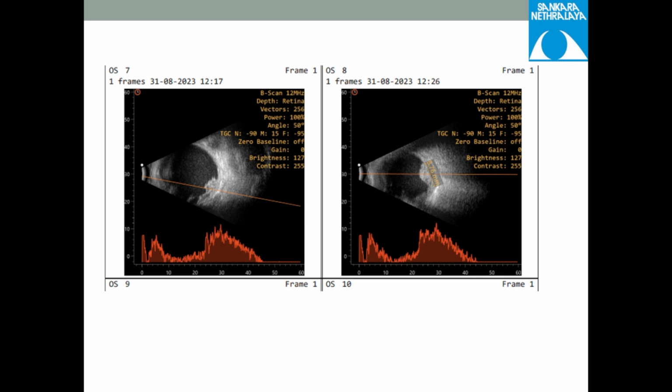It goes like a triangle with a slope. So that's angle kappa. So what happens if there's angle kappa, and what happens at the edges of the tumor then? So you said no acoustic hollowing. What is acoustic hollowing? Acoustic hollowing: it will be highly reflective, and in between the reflectivity will be low.